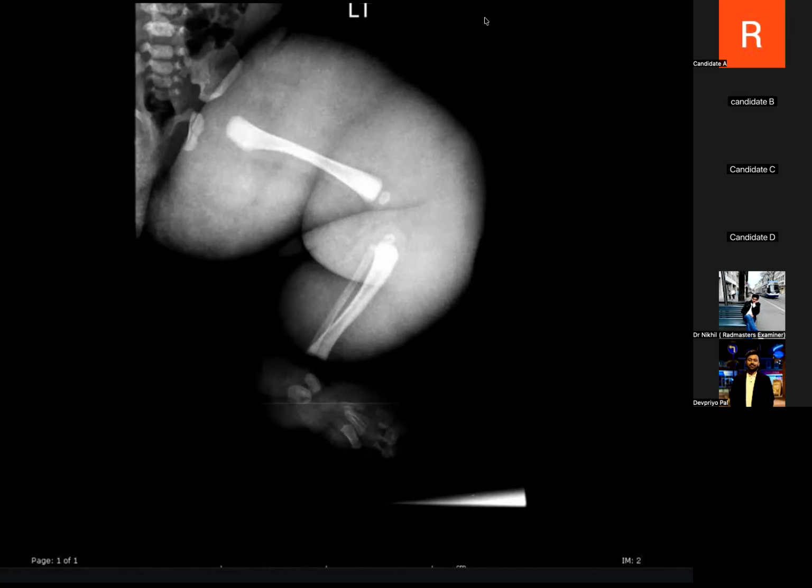I would consider it could be any vascular malformation involving the limb, or it could be hemihypertrophy, or a syndromic patient. So I will review any prior images. I would like to know about the contralateral limb. If it is normal size, then it could be hemihypertrophy if it is an enlarged limb. So I will review any other images and also assess the orthogonal view of this image.